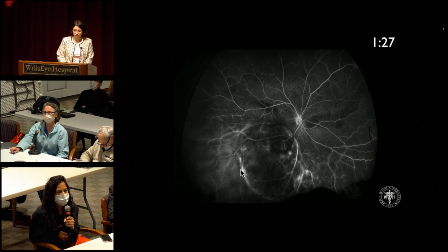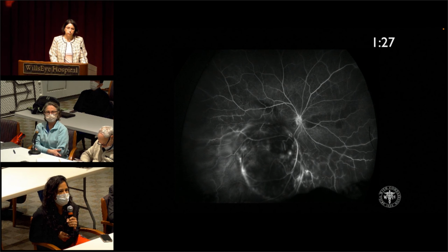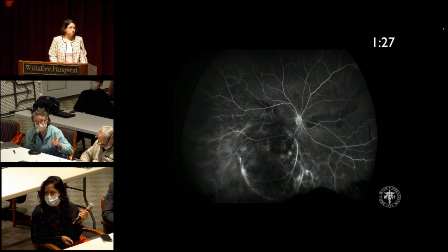Yeah, and then in areas adjacent to the mass, we see this diffuse microvascular leakage in the areas of likely subretinal fluid. And this is how we differentiate melanoma from RPE adenoma. RPE adenoma usually has a prominent dilated feeding artery and a draining vein, whereas melanoma has neither, except possibly rarely a draining vein, never a feeding artery.